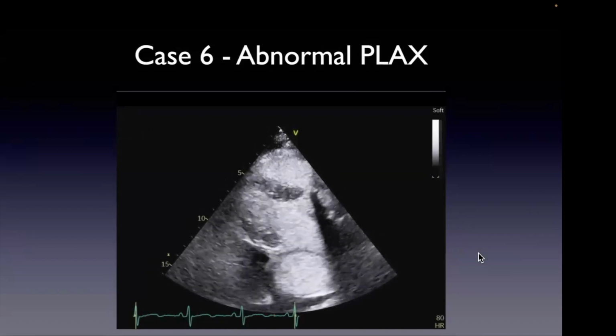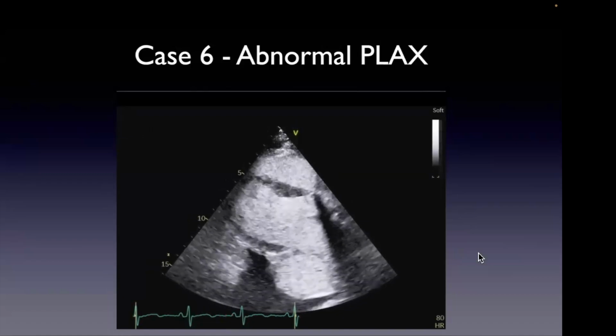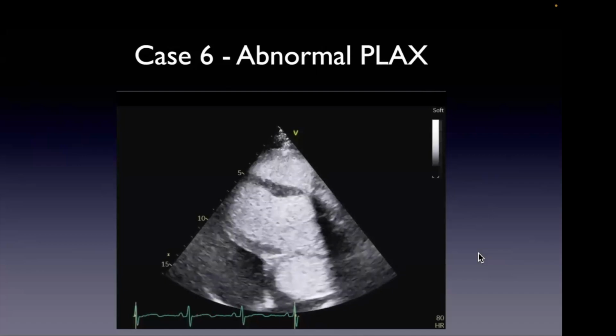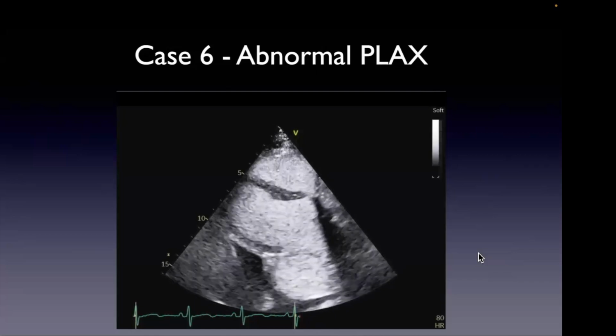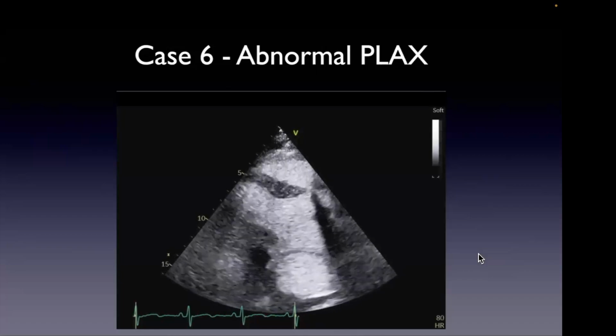You knew it was coming. So, nice example. Actually, this was done in part to look for dissection. Pretty large descending thoracic aortic aneurysm. Unusual, right? We don't normally see it this large. And actually, I can't remember whether or not the ascending aorta was also dilated.